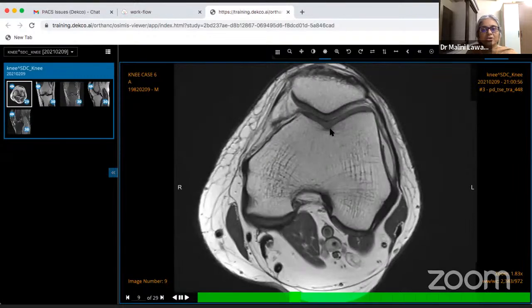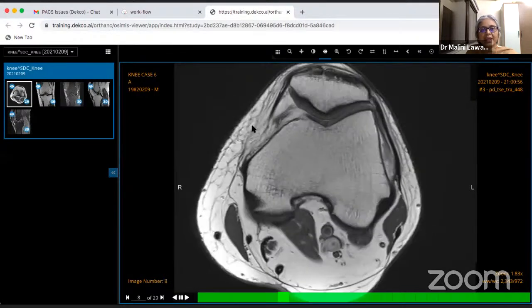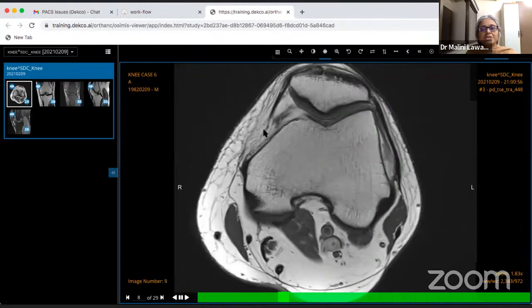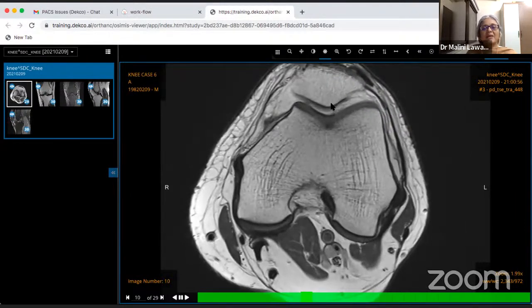This is a good section to look for the depth of the trochlear groove and what morphology it is, what shape the patella is in patients with patellar instability. This is the lateral patellar retinaculum. This is the medial patellar retinaculum. So look at the vastus medialis. Wherever that ends, that is the medial patellar retinaculum. You can see in this patient, this is the patellar attachment. This is the femoral attachment. It is a bit attenuated, but we see that often. So unless there are other findings, it may not be significant.